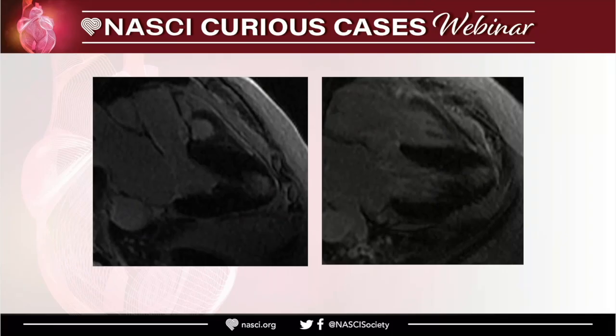The most striking functional difference is the apical obliteration that occurs in EMF, that's seen in both systole as well as diastole, whereas in HCM, the obliteration is mainly in systole. So that abrupt obliteration of the apical LV cavity that persists in both systole and diastole is seen in EMF. Whereas in HCM, it's a gradual obliteration of the left ventricular cavity from the mid cavity to apex, and it's mainly described in systole. So, apart from the morphology, the functional features also help us to differentiate these two.